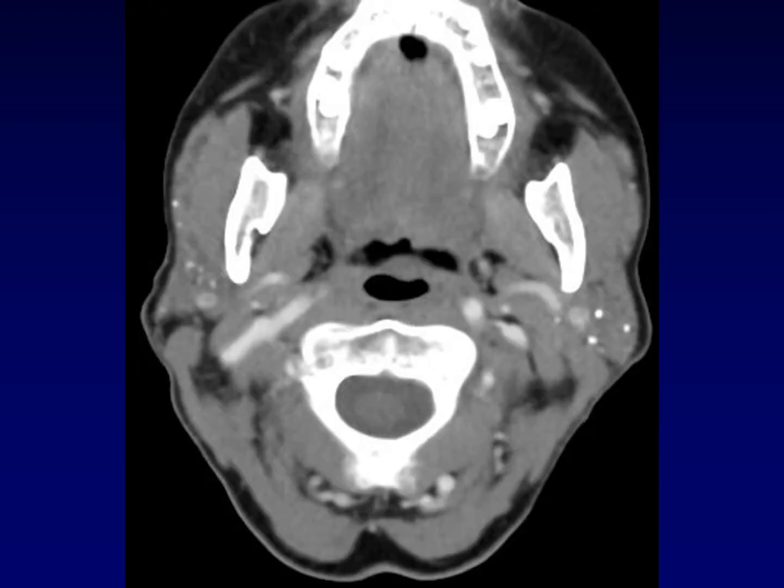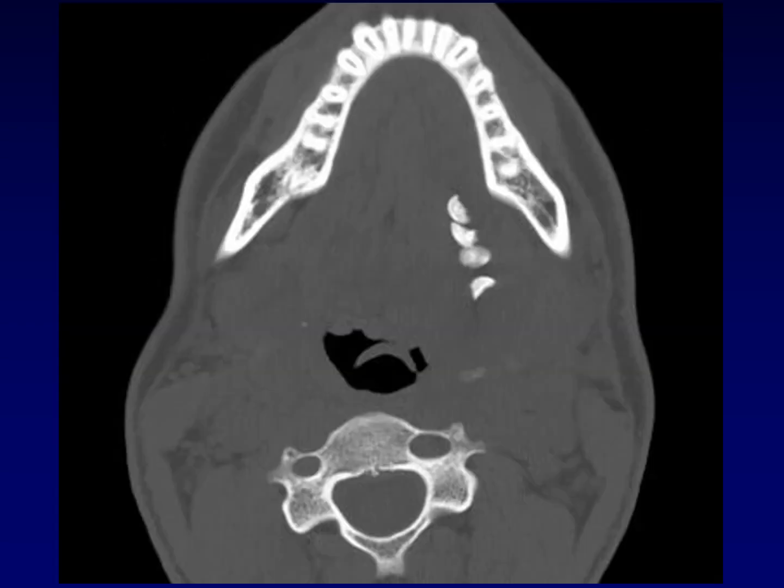Here's an example of parotid sialoliths within the gland itself. These are not causing obstruction, but they are at risk of doing so. Sometimes you will get a series of stones along a duct. Here are fragments of a broken stone that have lined up along Wharton's duct.